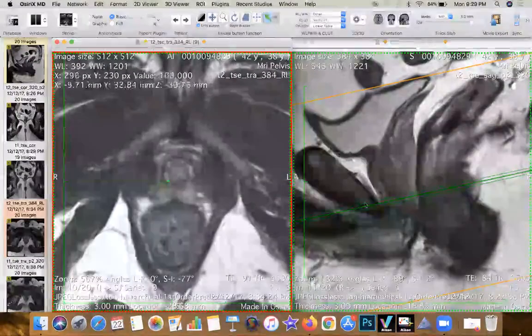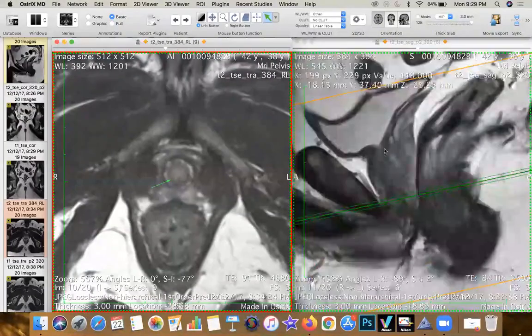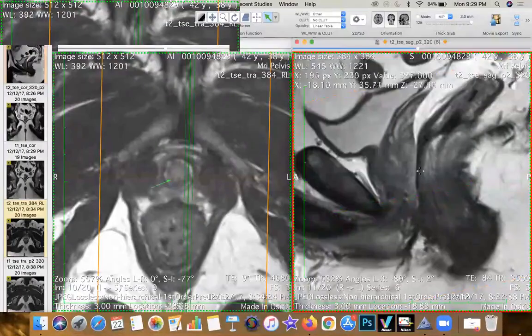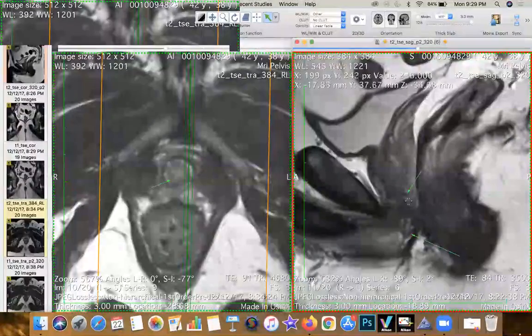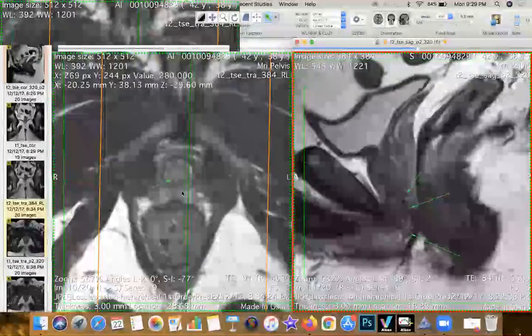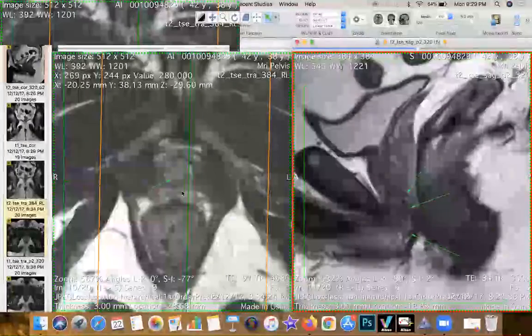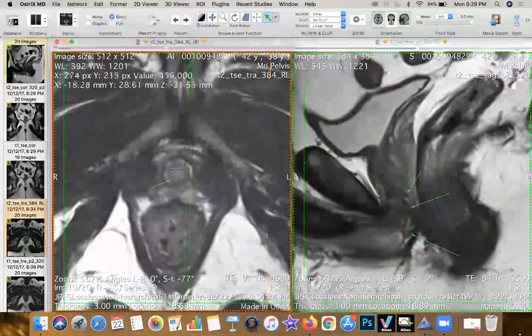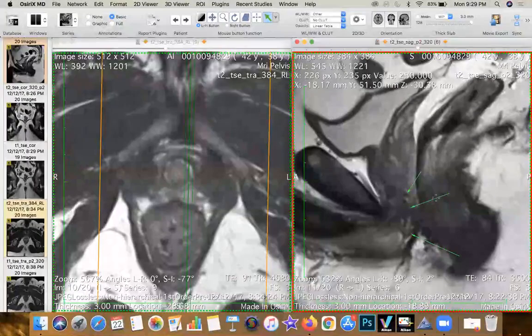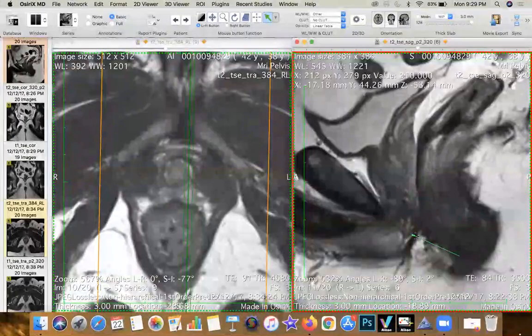Now this, like I would tell you, is the level of the membranous urethra. You can see it below the apex of the prostate gland sitting here. This is the bulb of the penis. And so this would be the transition zone. Ideally, this is the classic four-layered concentric pattern of the urethra you should be able to identify at this transition zone. The lack of identity of this sphincter complex usually is a poor harbinger when you're looking at laxity in and around the urethral sphincter itself.